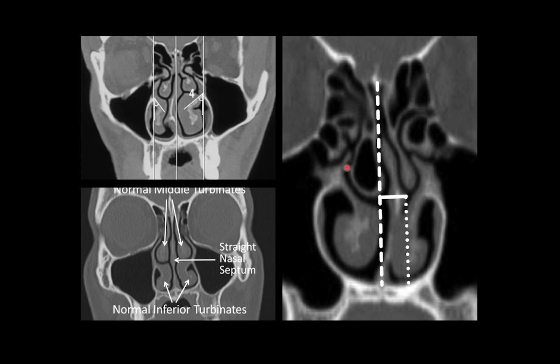Now we come to the paranasal sinuses. Just to recall your last session on anatomy, forget about these lines, but this is the nasal septum. It is deviated to the right side with a bone spur. Inferior turbinate, middle turbinates, maxillary sinus. This one, the same: a straight septum, turbinates, maxillary sinus, and this process, part of the osteomeatal complex.